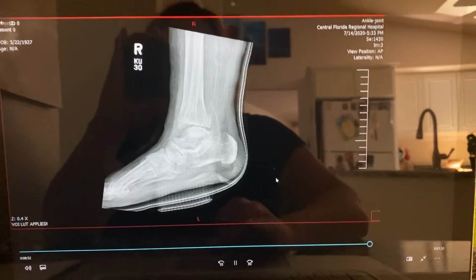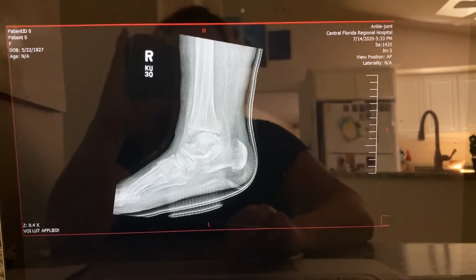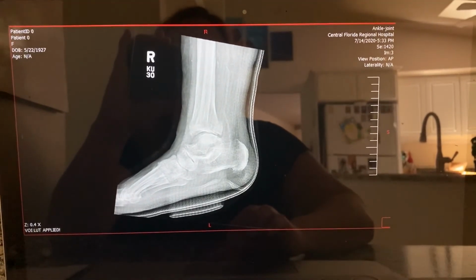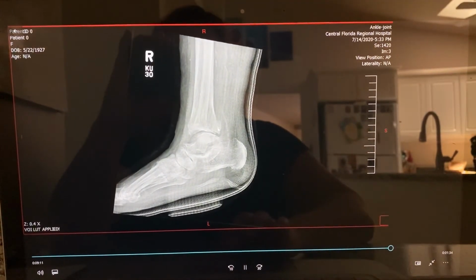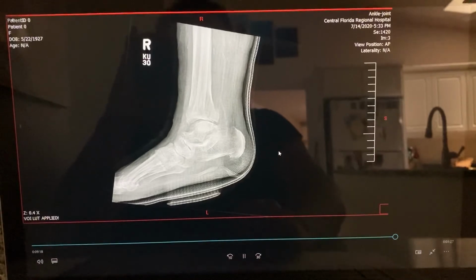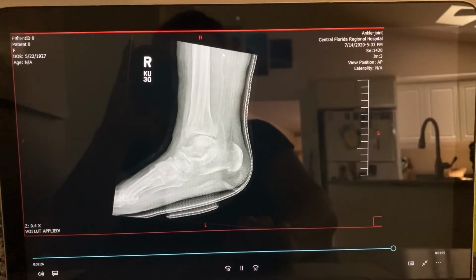The technique used was digital AEC at 60 kVp at 2.49 mAs with a negative 1.0 reading in the green. This image seems to show sufficient penetration. The pathology present included a previous trimalleolar fracture, and her cast would require a slight increase in the mAs, which is shown on this image. Also, the calcifications can be seen on this image. The images were of diagnostic quality.